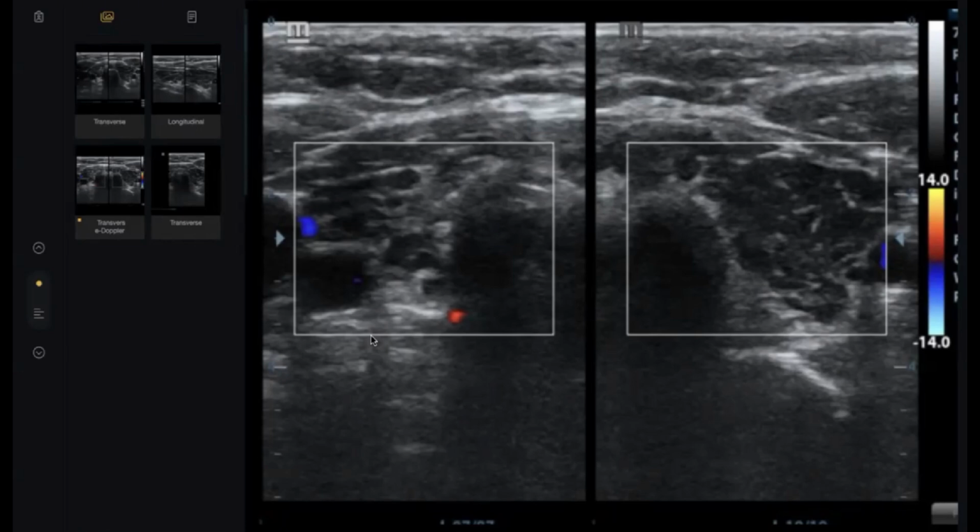In general, long-standing Hashimoto has many serious complications. Sir, it can complicate into a malignancy like lymphoma and carcinoma. Okay, brilliant. Thank you.